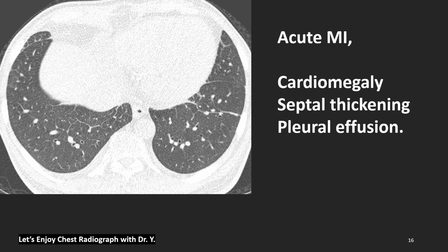This is just CT imaging of an acute myocardial infarction patient. What do we see? Yes, the heart is enlarged. Many septal thickenings. And bilateral small pleural effusion. Yes, congestive heart failure.